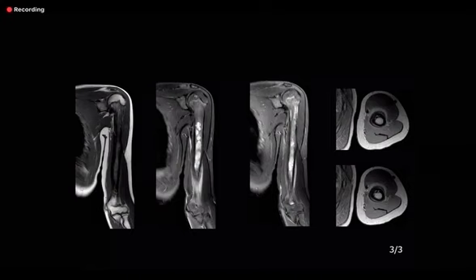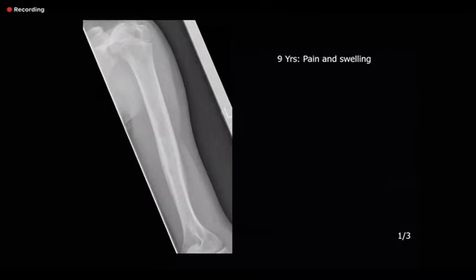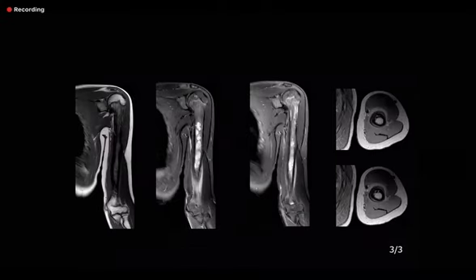Okay, fine. So another example, and just to make the point, it was much easier. It was not a subtle case. It was quite an obvious case. And just to make that point, this soft tissue component again is Ewing's.